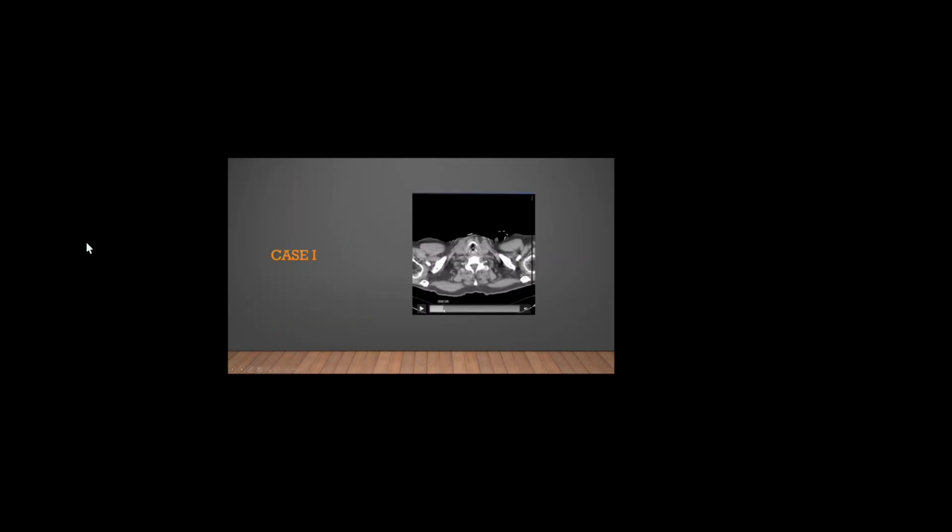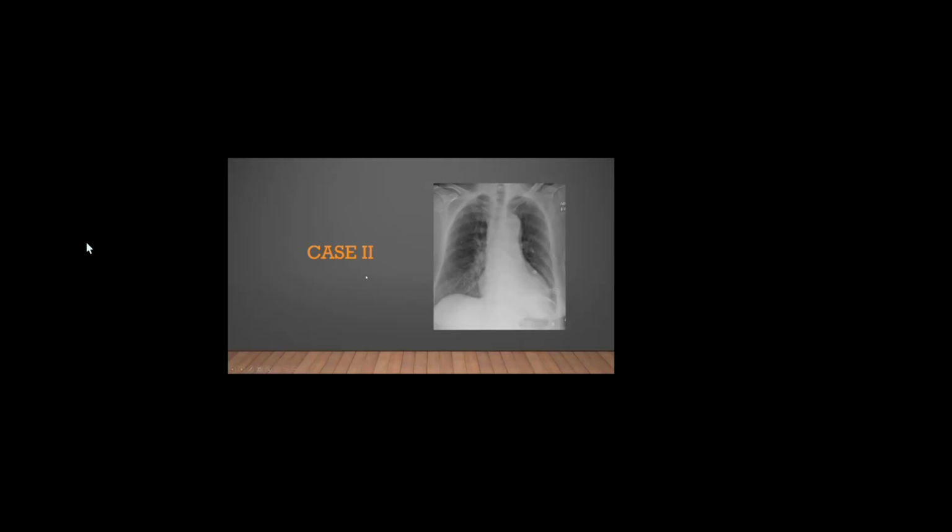For example, those two cases, the first case where the video should be playing. Effusion, again, we could see the crescent or the intramural hematoma that is extending almost throughout the entire aorta. If we make it play one more time, see it here, here, all around, the mural hematoma, the left lateral wall. That is a second case.